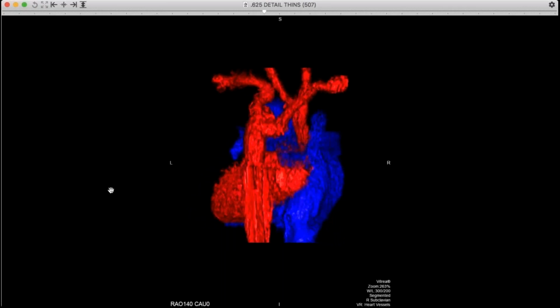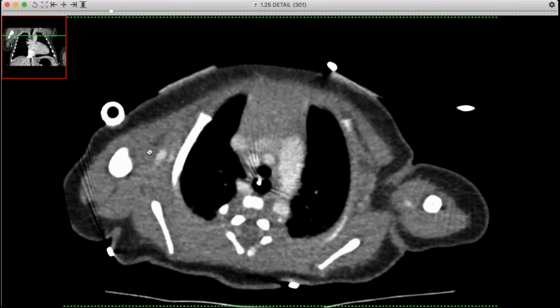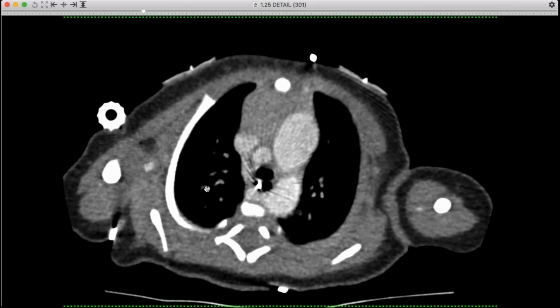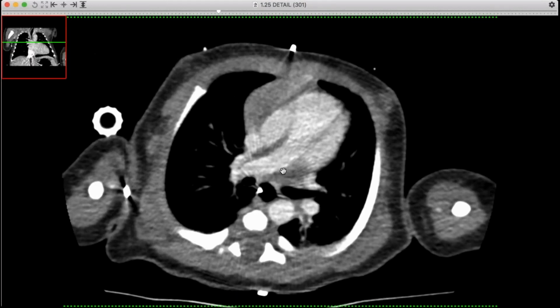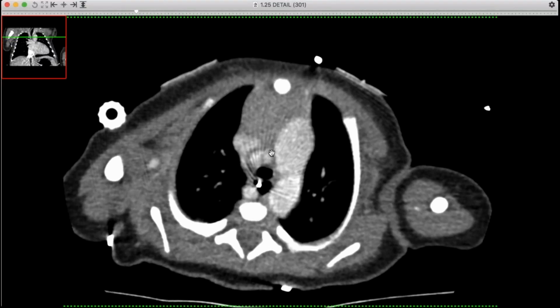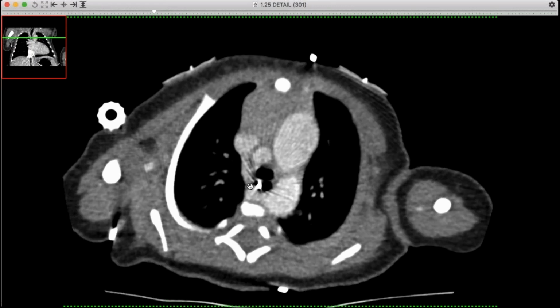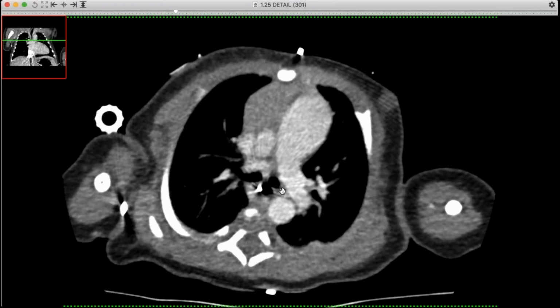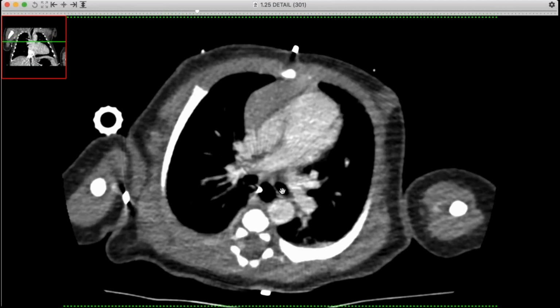So what you have, the pulmonary artery and the aorta come off the common trunk, and I'll go back to the axial, and give rise to each of the separate ones. So this is the truncus right here, and there's the aorta coming up with its branches. You see it's a right aortic arch, aberrant left subclavian, which then communicates, and it descends on the left, and it communicates with the patent ductus there.